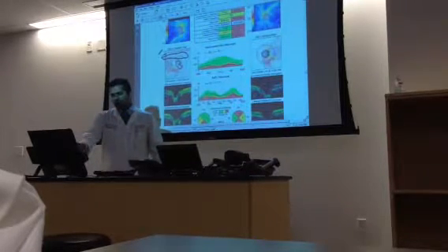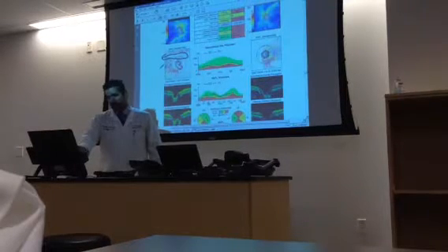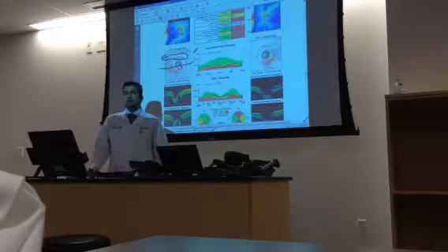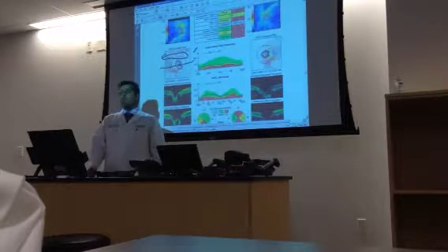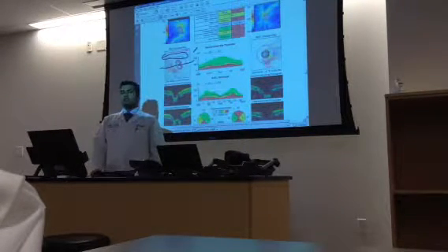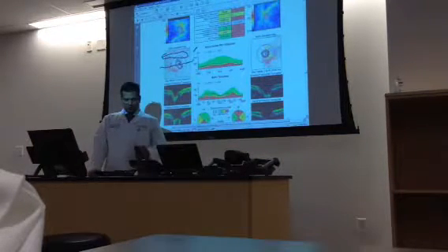This disc looks really funny, but it's not really. It's actually eye movement right in the middle of the disc as the scanning was occurring. Okay, so this person has not kept their eye steady, and there's lots of eye movement artifacts. You need to write that down. Even though the quality is good, there's too much eye movement, you may consider repeating the test for this patient.